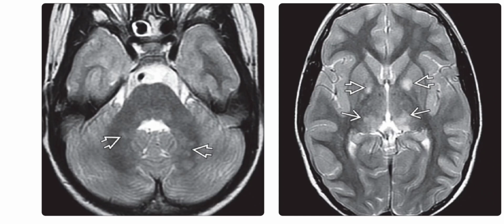The right image is the more cephalad image of the T2 weighted MRI in the same patient, and it shows the hyperintense foci in both globi pallidi, as well as patchy hyperintensities in both thalami. 6 years later, all the foci had completely disappeared.